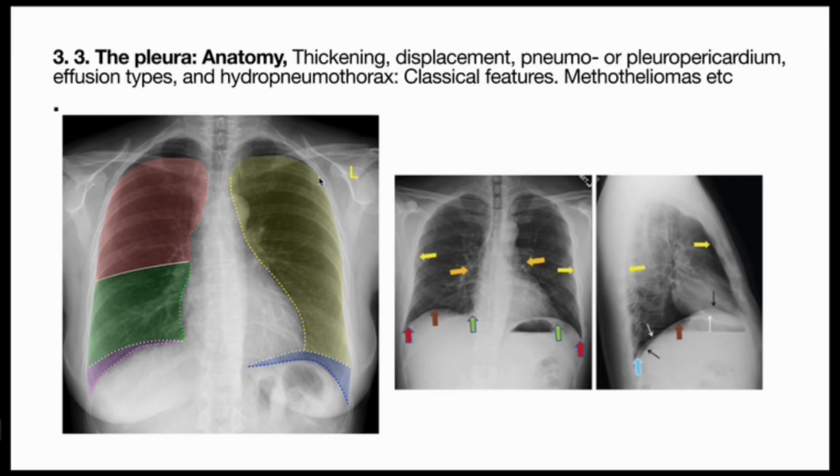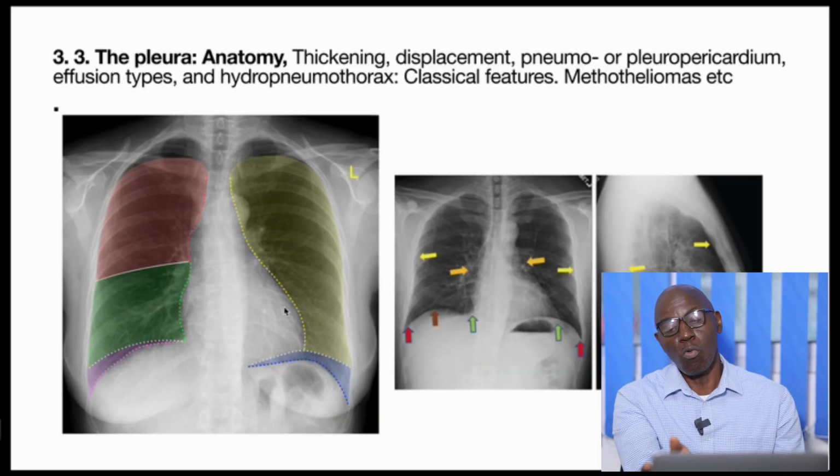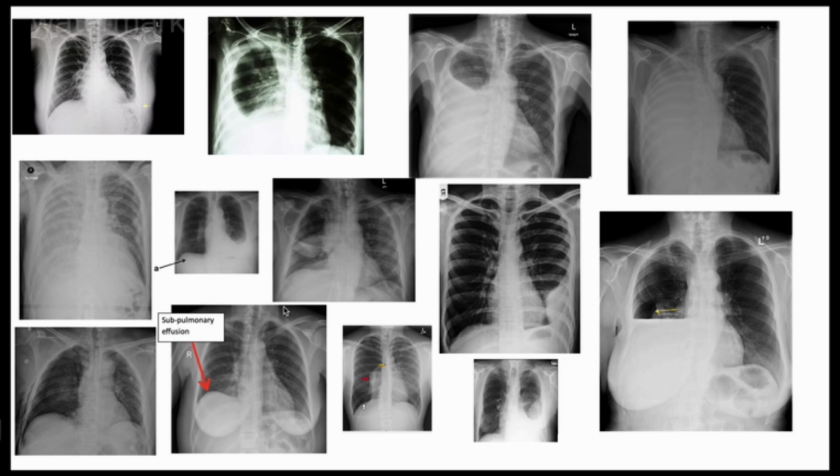In this diagram, just roughly to show you what we look at when we're looking at the pleura. Of course, on the left, we have two lobes, the upper lobe and the lower lobe, shown in blue there. And on the right, we have three lobes, the upper lobe, the middle lobe, and the lower lobe. Here, again, shown in those colors. And what we normally see on a chest radiograph is that transverse fissure. The transverse fissure is usually at the fourth anterior rib. That is where we get it. So when you know where the pleura is located, then you can quickly tell about the pathologies.